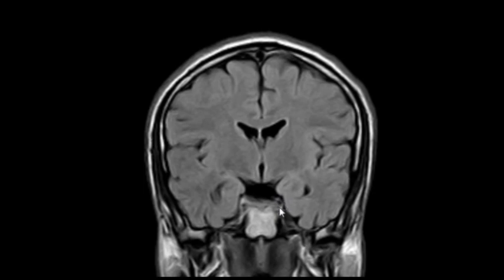Hippocampal and parahippocampal. Looking for what? For medial temporal sclerosis, mesial temporal sclerosis, MTS. Yes, or herpes encephalitis. Herpes encephalitis is another cause. Good. Or, for example, not infarction, because the history does not go with it. Okay. What are the findings that you expect to see in cases of MTS or mesial temporal sclerosis?